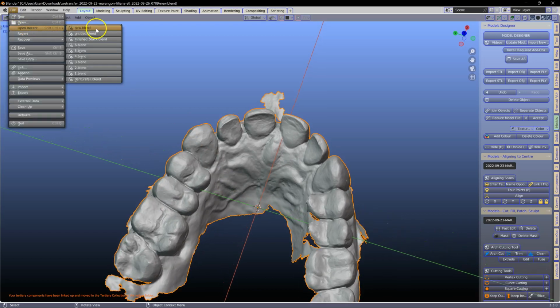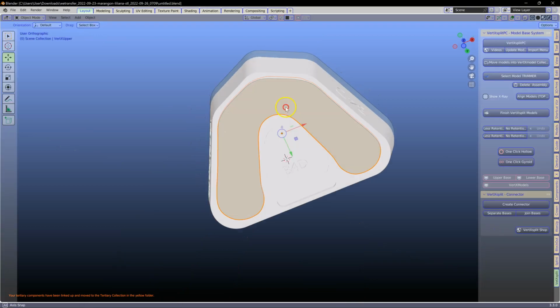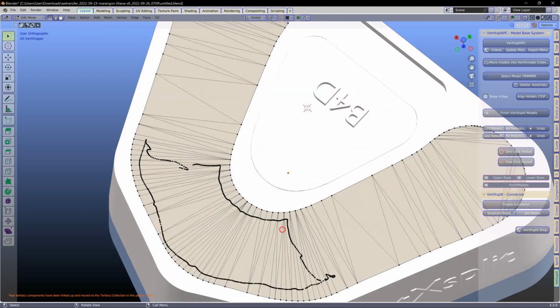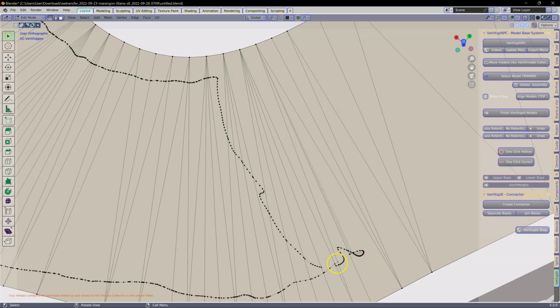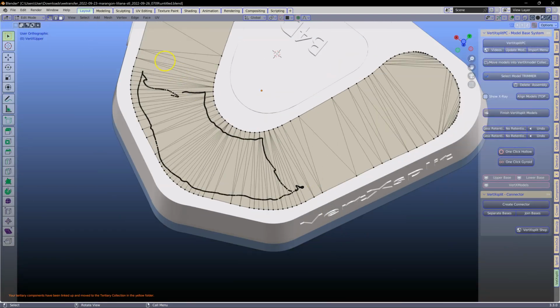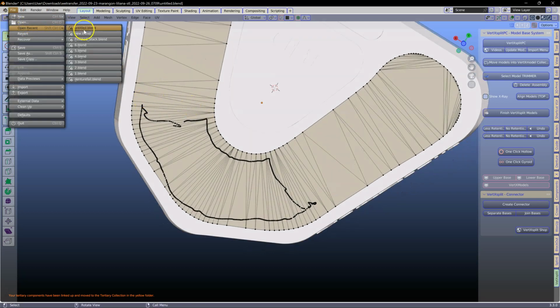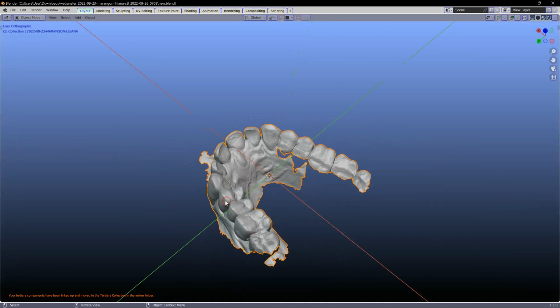Now, if I look at what you have, we've got a Boolean problem, and here we can see that your model, this was your outline of the model, and we cannot have this. Okay, so this is a model making problem. I will demonstrate how I would do it.